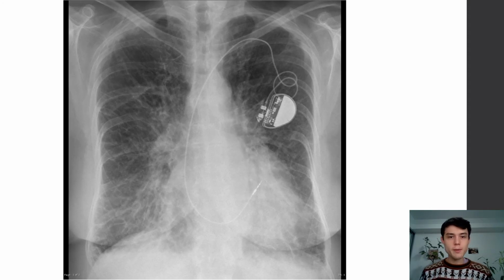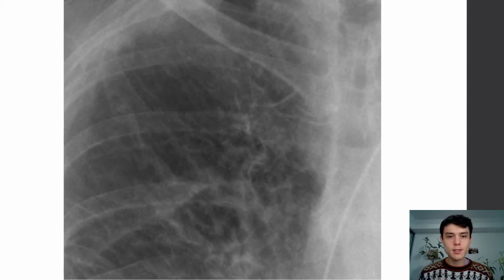There are also some air bronchograms, where the translucency of the bronchus is surrounded by fluid, and therefore you can see these demarcated areas of a dark line running through the chest X-ray. And in a zoomed in image, you can just see them over here, these air bronchograms.